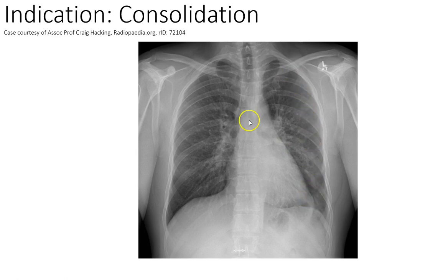The lung markings do look increased throughout, so maybe there's some inflammatory exudate on top. This X-ray was posted as an example of consolidation, and this is where I would pick it primarily to be. Possibly a bit in the right mid-zone as well, though.